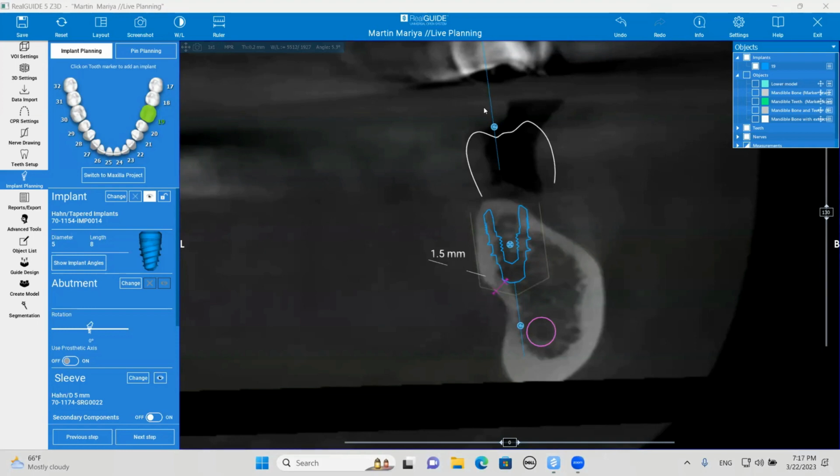So we certainly don't want to go down to any smaller diameter implant. Ideally, we want between a 5 and a 6 millimeter implant for a molar, and that will give us proper emergence profile. So on this case, you have two options.